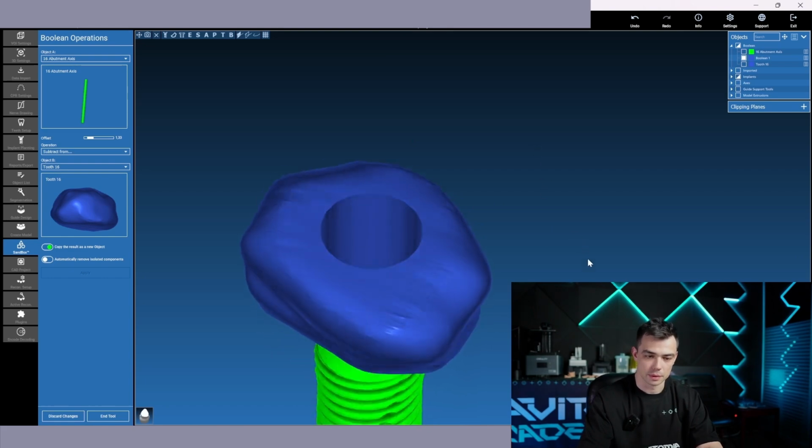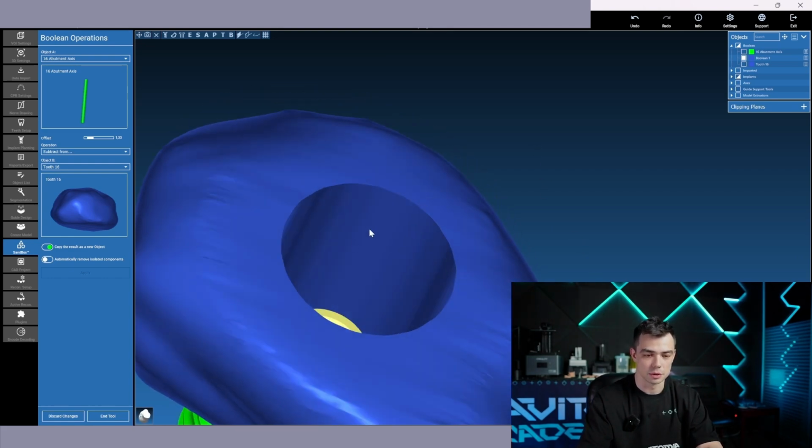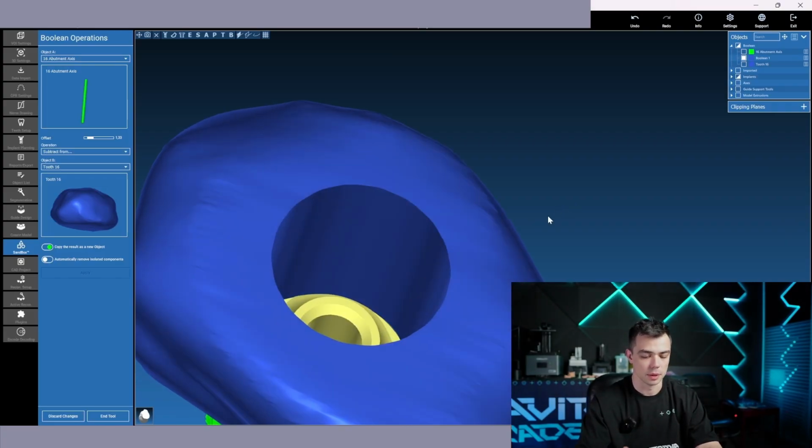When you have printed it, it's a rather cool idea to make some scratches here, or make some holes or something like that, just to make a mechanical retention for the future gluing material, just to connect your abutment with this gum former, because there will be no chemical connection between these two parts, only mechanical connection.